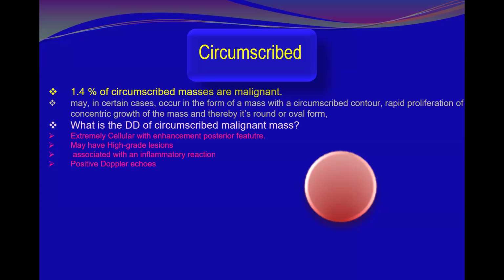Medullary carcinoma. Medullary, excellent. Metastasis, excellent. High-grade invasive ductal carcinoma, excellent. Mucinous carcinoma. Mucinous and? Papillary. Excellent. And?